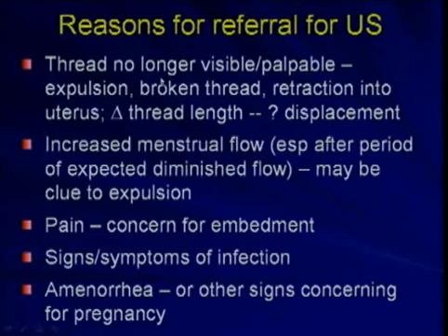What are the reasons for referral for ultrasound in women with IUDs? Commonly, the thread is no longer visible or palpable, and there is concern about expulsion or a broken thread or retraction into the uterus. Also, there may be a clinically apparent change in the length of the thread, which suggests the possibility that the device has become displaced.